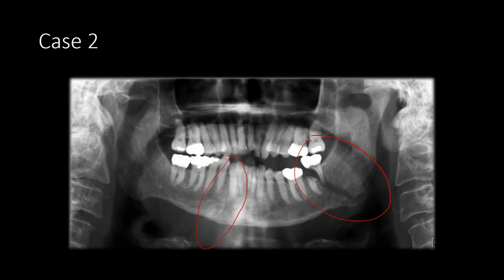But you can also see there's a little step off of the inferior border there. I would encourage you as well not just to look at the bone, but look at the teeth, because it really tips you off to where a second fracture might be. Look at the occlusal step off here. That's a pretty big jump, certainly bigger than on the other side. So looking for bony step-offs or occlusal step-offs are really good clues that suggest an additional fracture.